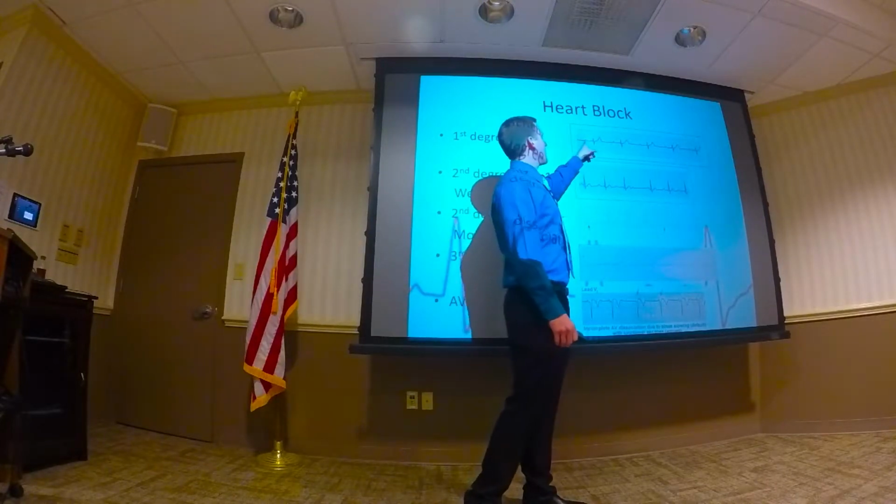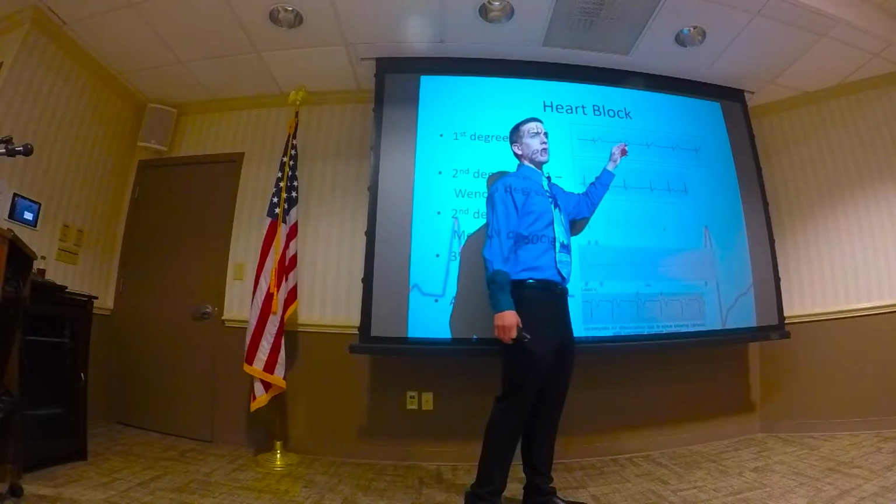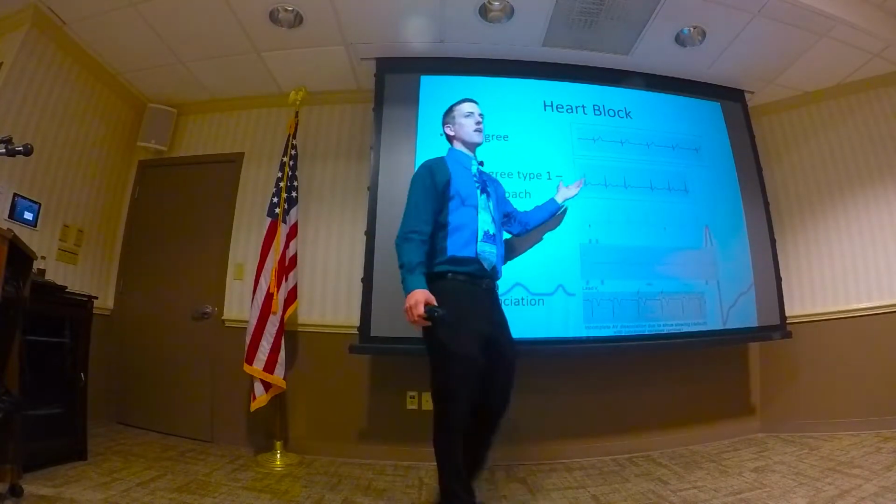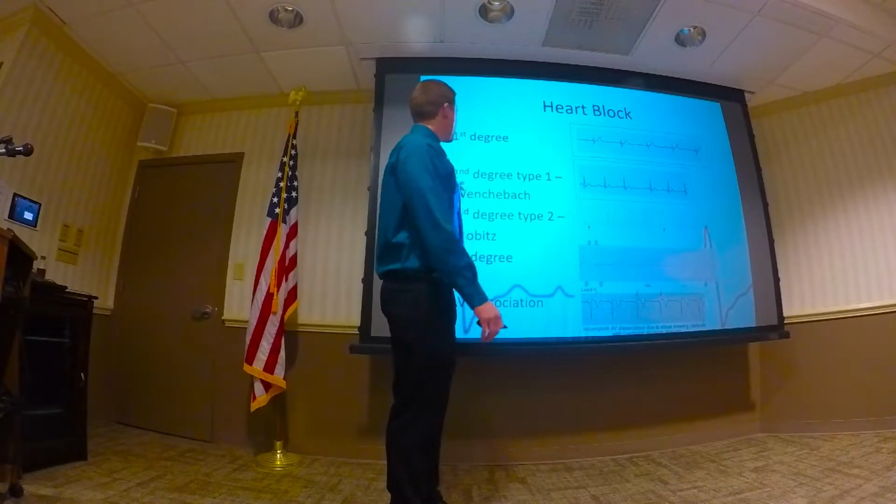So in this case, this is more than one big box, right? More than 200 milliseconds. And so that's delayed. So that's a first degree AV block. Cool? Second degree AV block.